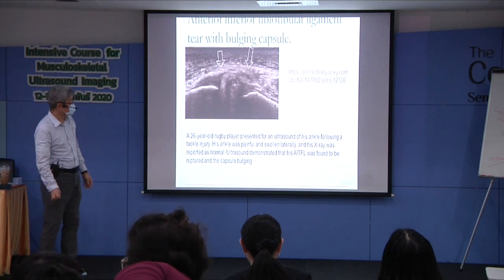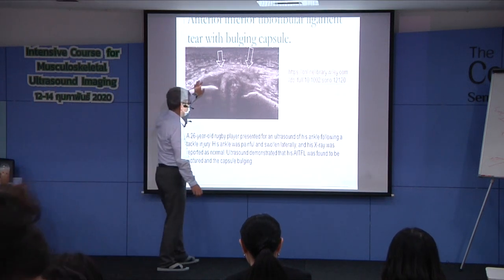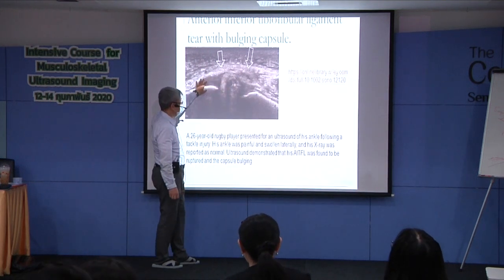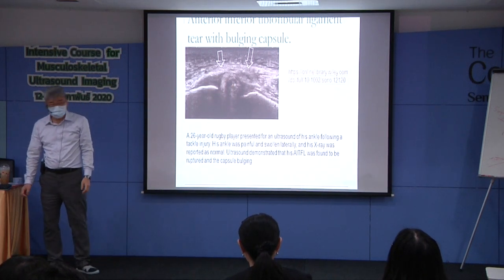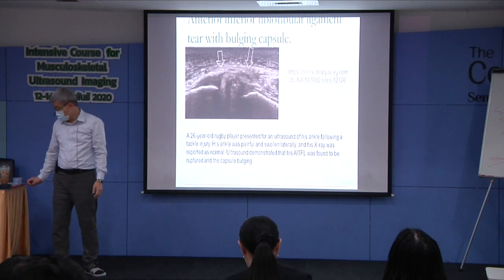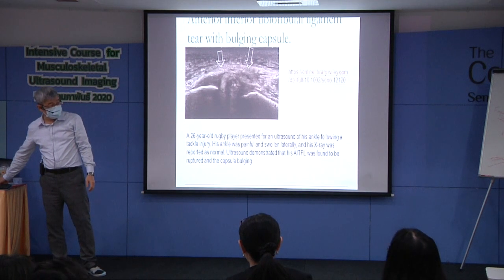This one is not normal, okay? The fiber cannot be observed. The morphology becomes thicker. There are some inhomogeneous signals inside. So that means a severe ankle sprain. And we probably need to check the syndesmosis as well.